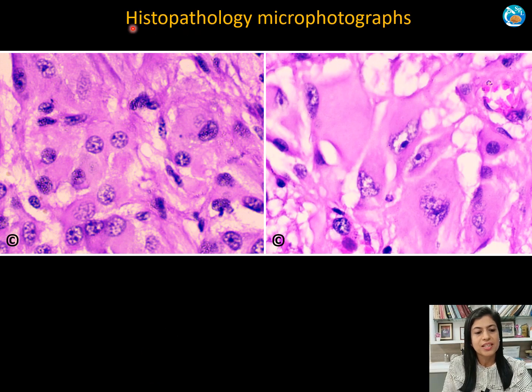The neoplastic cells have small round vesicular nuclei, and at places the chromatin appears clumped, with a moderate amount of eosinophilic cytoplasm. Whereas the large polygonal cells with ganglionic-like appearance have eccentric nuclei containing prominent nucleoli and abundant glassy cytoplasm.